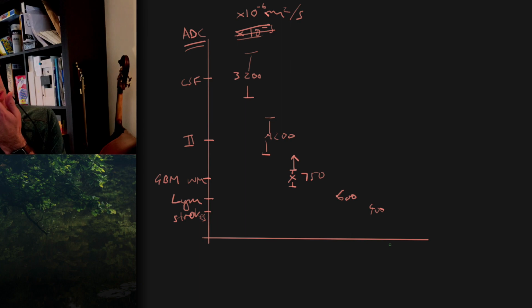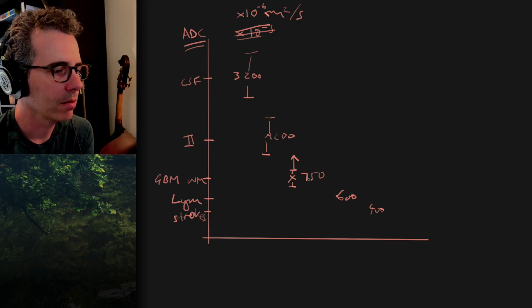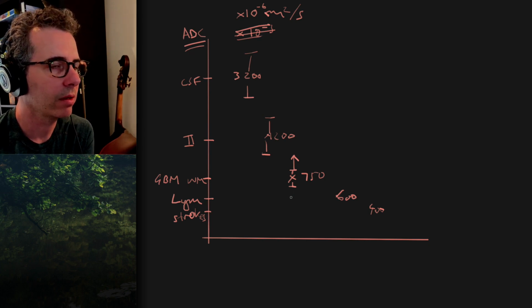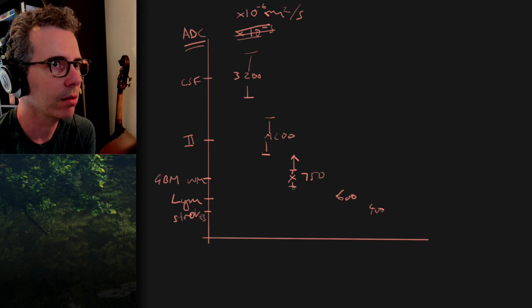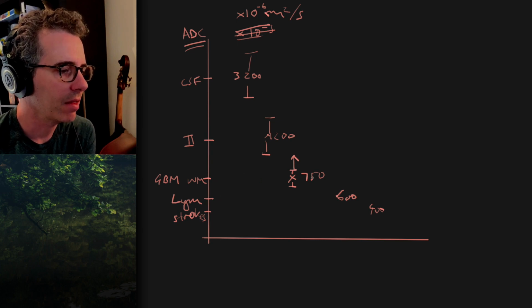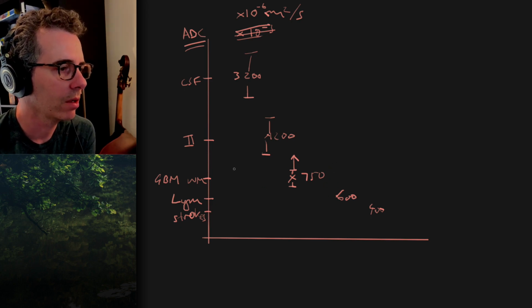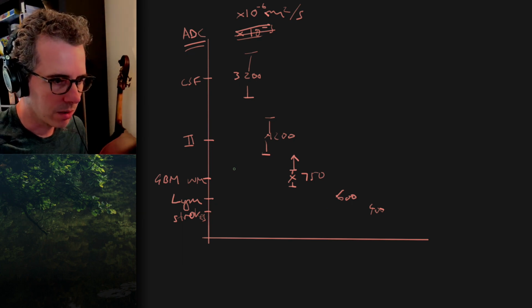So when you say there's no abnormal diffusion restriction, I don't know what that means, because if you don't know what the thing is, it doesn't help me that you're not giving me a number. It'd be like saying there's no abnormal CT density in a lump. What you mean is, give us a number or tell us what it's similar to. Anything other than what it's meant to be if it's brain is abnormal in both directions, abnormally facilitated or abnormally restricted. I'm sure we will cover ADC values again, knowing my penchant for it.